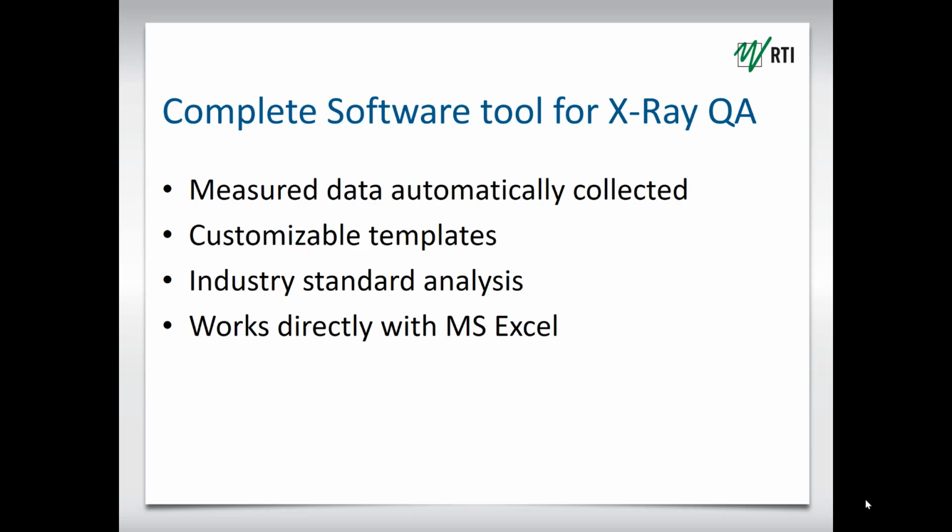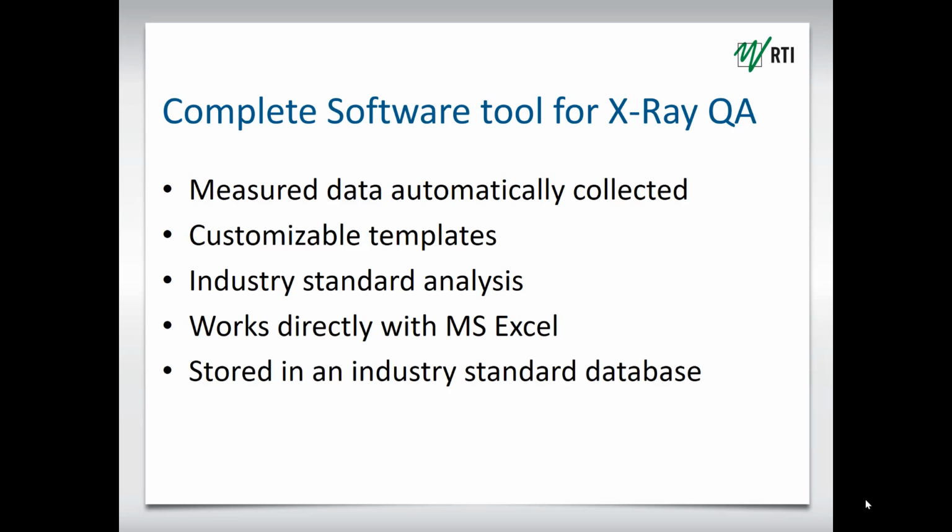Ocean allows you to link your data to an Excel spreadsheet with automatic filling of the spreadsheet as you take your measurements, along with the ability to store the Excel sheet with your Ocean template. All of your data is saved and stored in Ocean's industry standard database. Finally, Ocean can produce customized reports in hard copy or soft copy like PDFs for the facility you work at or for some other facility that you support, giving your results a customizable professional appearance.